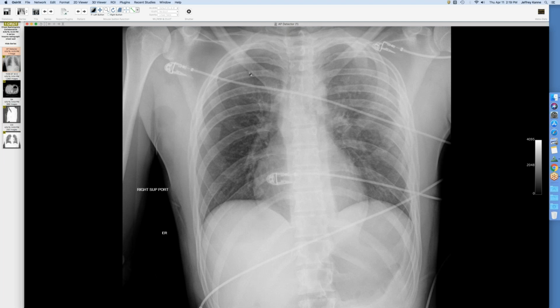But the important thing when we look at these radiographs is they're very low sensitivity unless you're looking for major things. There's some haze up here. You wonder if there's contusion or something. But more importantly are the mediastinal contours. You can see this right paratracheal region has an outward convexity and it's abnormally dense. So the paraspinal line is displaced. The left paraspinal line is more conspicuous than normal, probably because it's displaced laterally.